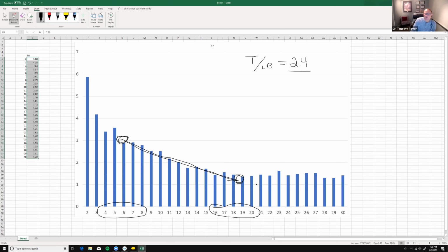Now, in the area of high beta, the way that should look is a slope where these SMRs are falling right here, to create a high beta ratio of high beta over top of what's called SMR. We talked about that a couple of weeks ago, that's that perfect rhythm.